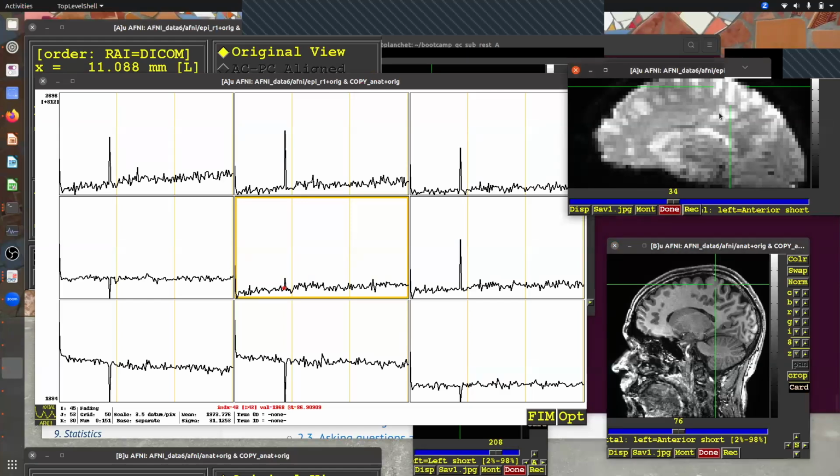You probably notice some different feature in the time series now. There's a giant spike. Importantly, this spike is not always in one direction. Sometimes it's up, sometimes it's down, sometimes it's really big, sometimes it's smaller.